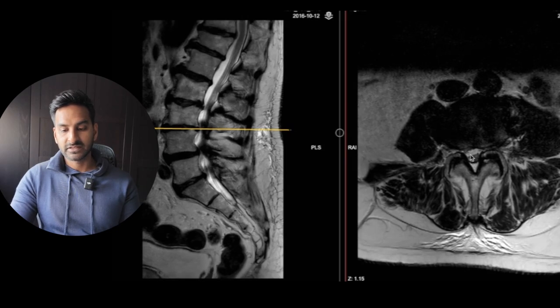It's less pronounced, isn't it? You can actually see a fair bit of CSF fluid. You can see the ligamentum flavum is like this. It's not pushing too much away. You can see a few dots within there, which are going to be the descending nerves, and you can see just in those little recesses here, tiny little dots, which are going to be the descending nerves as well.